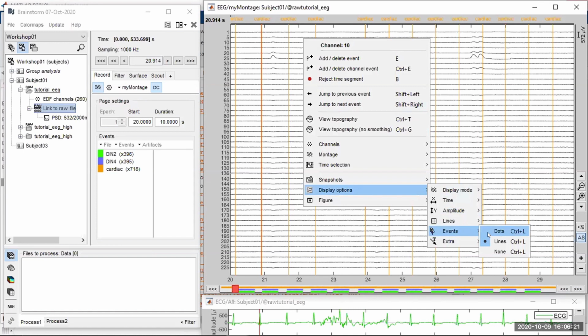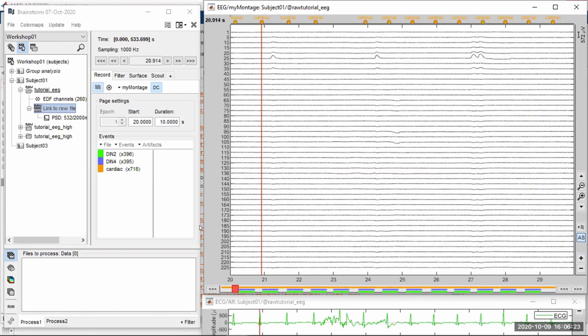Go back to dots. Okay, so this is heartbeats, but you can also do the same with eye blinks. And this is what I'll demo today just because the difference is so obvious, night and day, when you correct an eye blink artifact that even through my average internet connection, I'm sure you'll be able to see the difference.